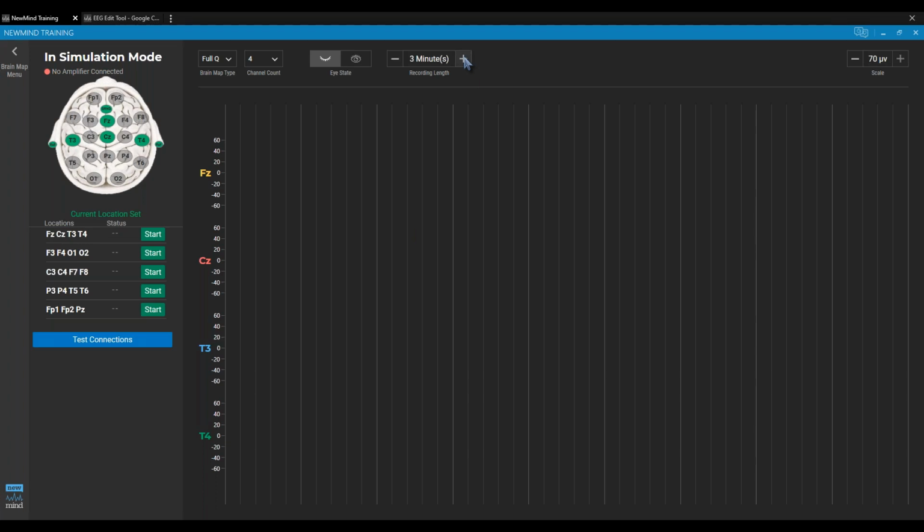If I'm seeing that 60, 70% of the time it's artifact and the rest is clean signal, I'm going to have to go to 4 or 5 minutes. It's going to be a long recording, but that's the only way I'm going to acquire that map. And then some of us have had these clients that, no matter what you do, it's just all artifact.